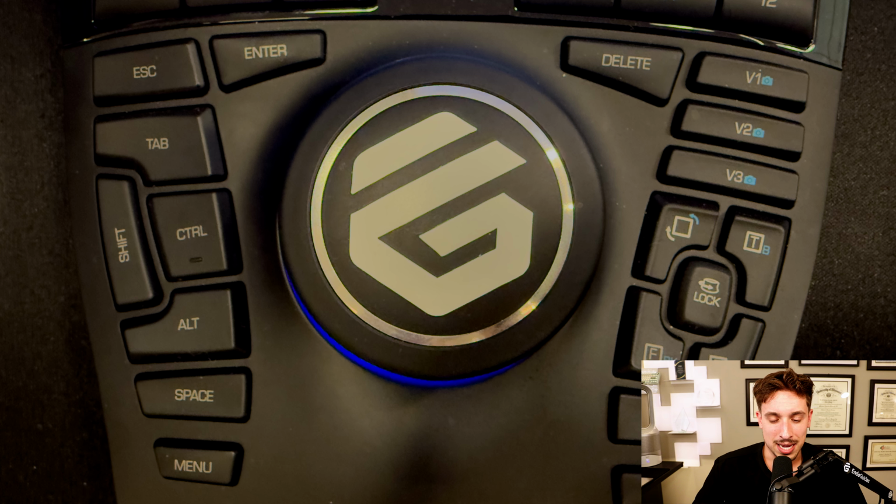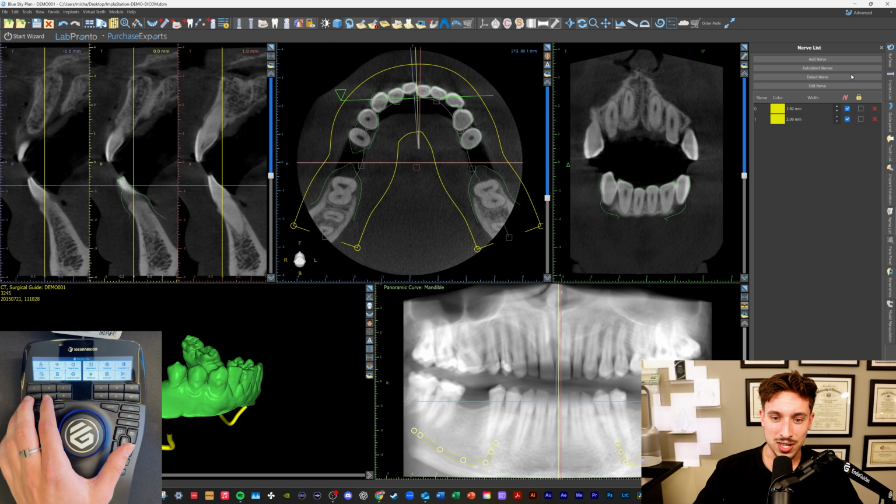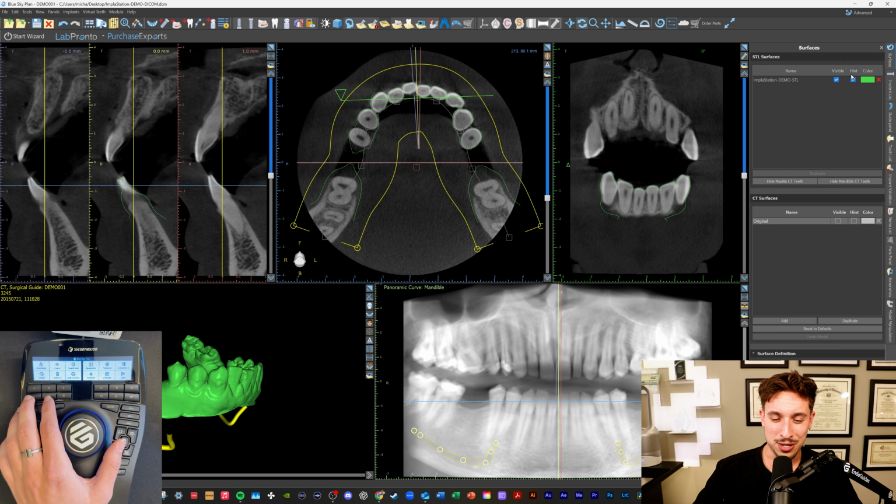Again, it's small optimizations, but small optimizations across a large sample size will yield some more efficiency and decrease time for the same end result. So that's what this looks like. So if you see me hitting those buttons, that's what I'm going to be doing with this.